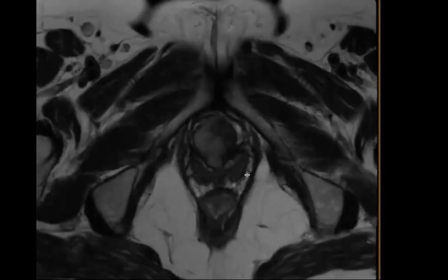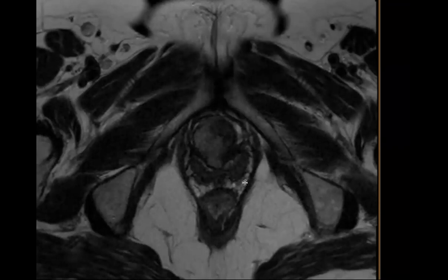Wow. Is that carcinoma within a diverticulum? So not within a diverticulum, just a urethral. Well, it could be in a diverticulum. At this stage, the shape of it, it was just reported as urethral carcinoma, but it could be in a diverticulum. Reason being, I'm going to take you back.